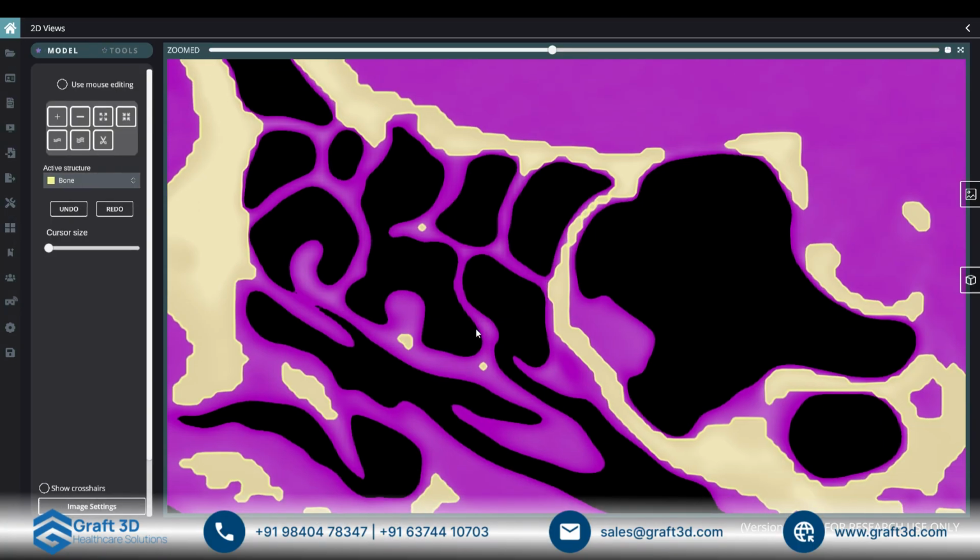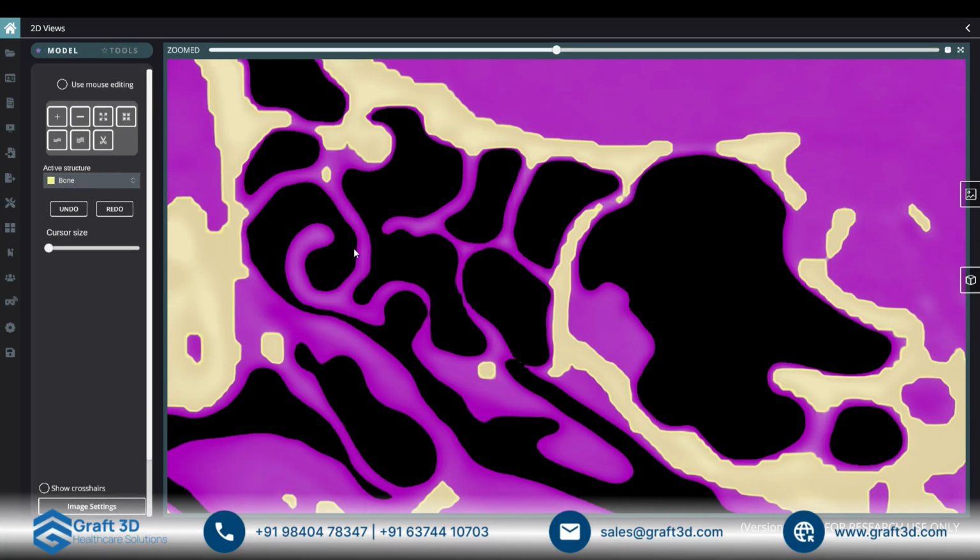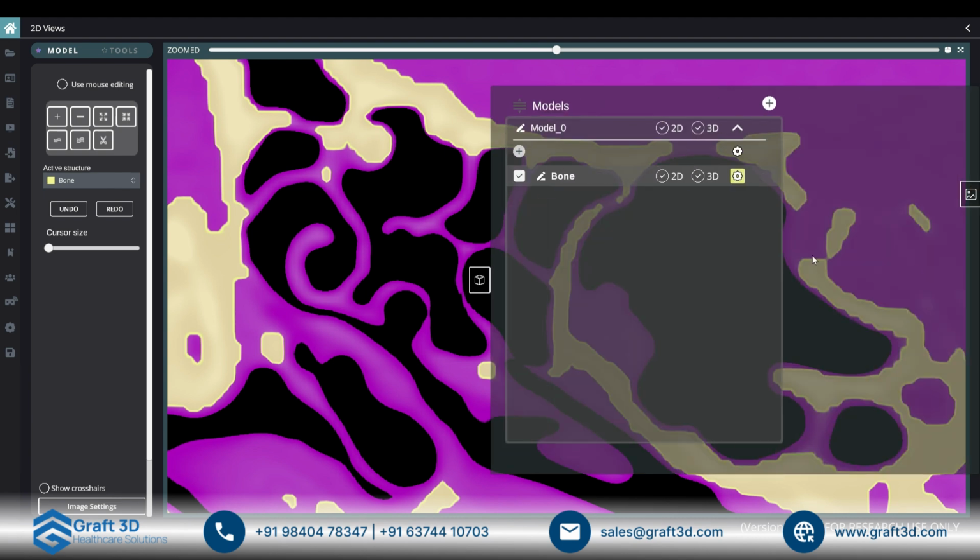Only when we're dealing with tiny anatomy such as the turbinates, or even, obviously depending on the level of detail of your CT scan, the mastoid air cells. So in this case, I'm going to set the level of detail to be ultra.